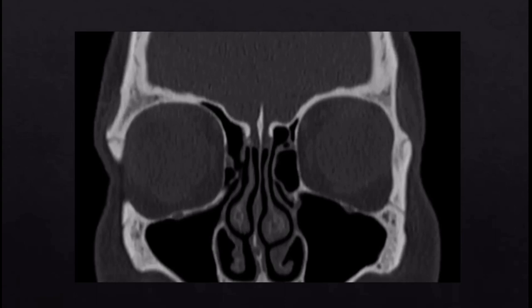So here we can see the roof of the nasal cavity, and it's formed here by the cribriform plate. And the cribriform plate should sit either halfway down the orbit or above that level. If it's lower, you need to say it's low-lying because the surgeon's more likely to hit it with an endoscope during surgery. On both sides here are the lateral lamella and their direct continuity of the middle turbinate basal lamella, which you can see here. And you can see the basal lamella.